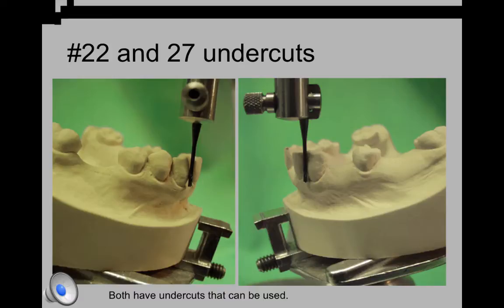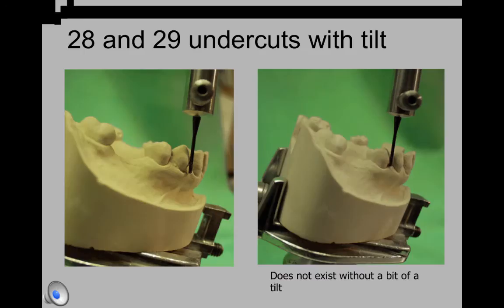But there's nothing wrong with the 22-27 mesiofacial because we do have the 0.01 undercuts. It is a solution. The mesiofacial of number 28 and 29 can also be used depending on the tilt of your cast. That's why there are so many varieties of solutions for clasping on this particular cast.